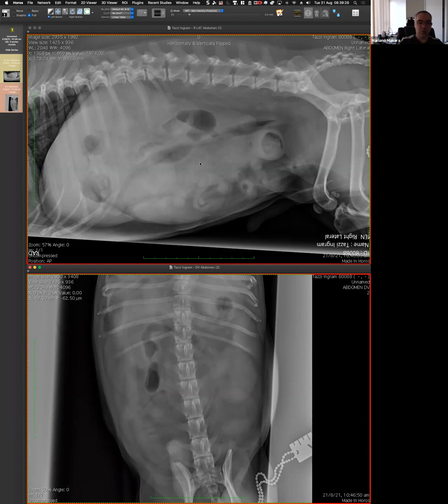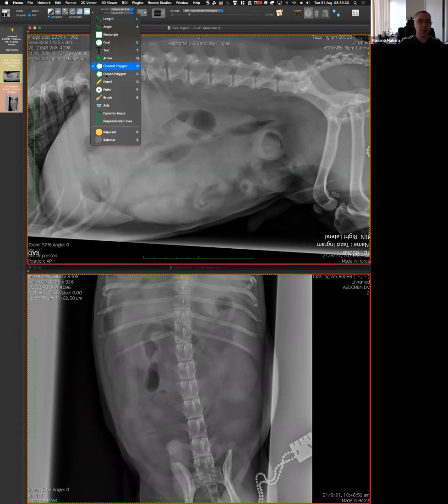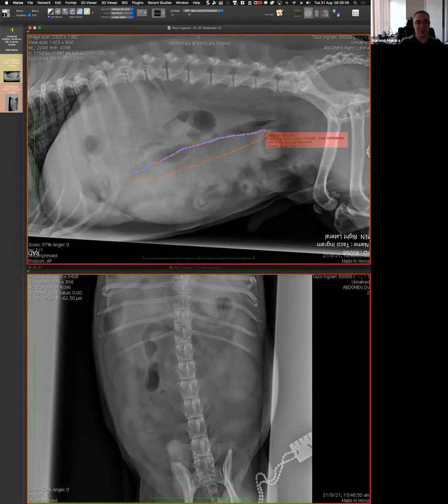So, for example, now that I pointed that out, probably it's easier for you to see, well, actually that line goes like this and continues. And now that I show it, it's there. I mean, that's a clear thing. And then this, it goes across and it goes over. Makes sense? So it cannot be part of that structure.